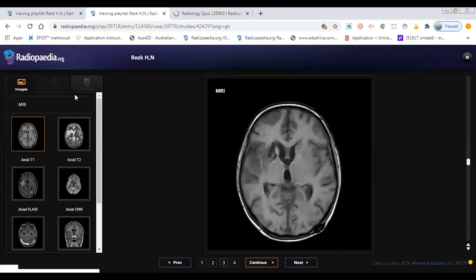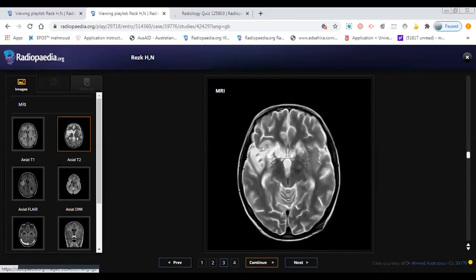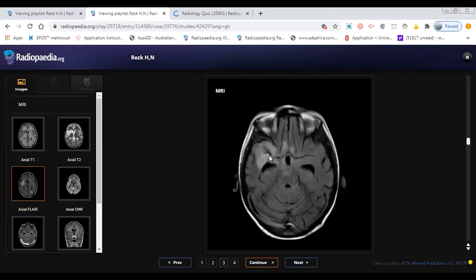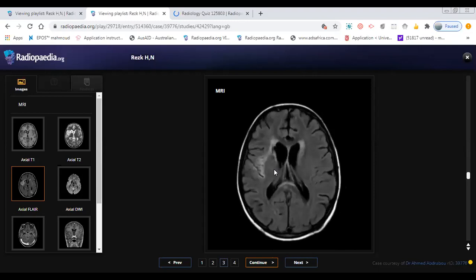So this patient, I think he has something. He took a treatment. Let's have a look at what he took. And he presents with this appearance. Yeah. And you can see that there is something going on here more obvious than the others.